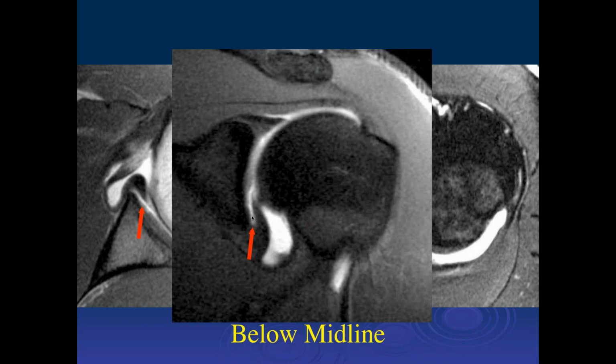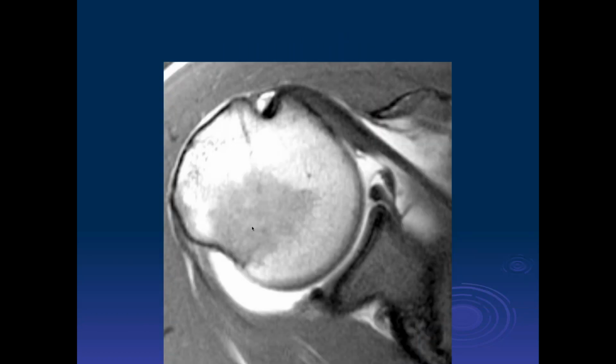Yeah. And here we can see this extends all the way to the inferior labrum, but it's not really going into the labrum itself. At arthroscopy, this was thought to be an injury to the labrum, which was a little bit more loose than it normally should be, but the actual labrum wasn't torn. So they ended up not repairing it, but they thought it was not normal. Okay.